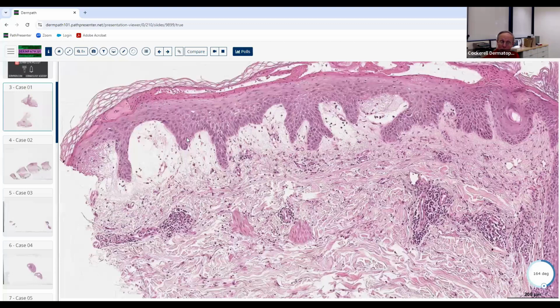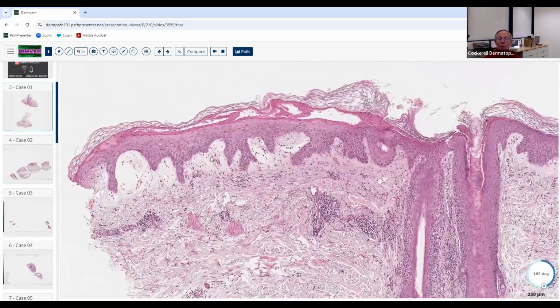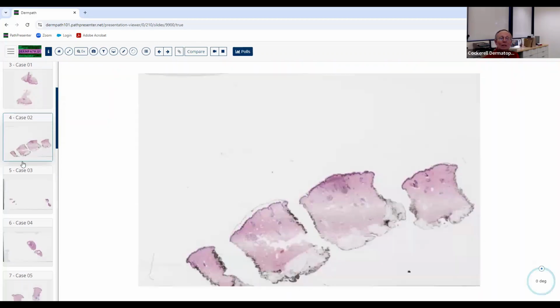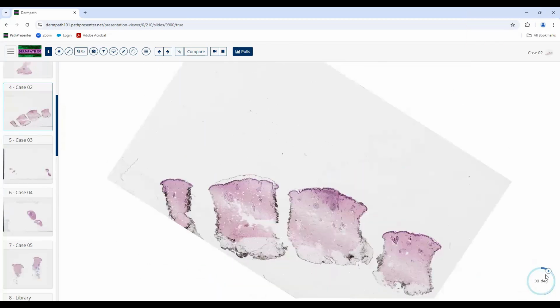And there's subepidermal blisters. So here it's due to the papillary dermal edema that caused it. This probably also contributed, but this may be why it probably looked bullous to the clinician. Okay, good. It's a good differential. A good way to kind of think about that.